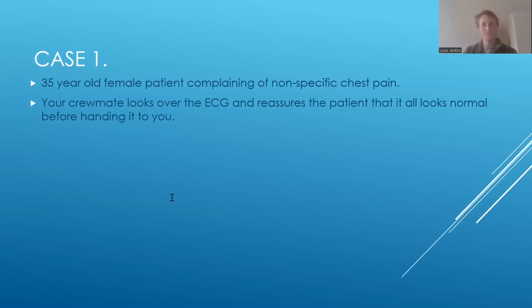Okay, case 1. So now we're going to get into our case reviews. That's all of the theory done with, more or less. So thank you for bearing with me up to this point. The way this works is I'll give you a case. There's going to be very few details on the case because the focus is really on the patient's ECG.